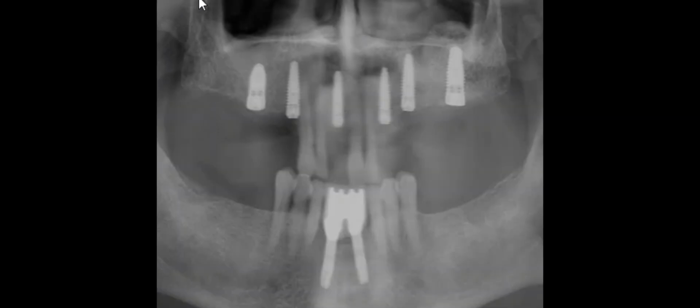Okay, here is the X-ray immediately after the upper implants were placed. You can see here the nice grafting of the sinus, providing us with significant bone in this area for this long implant. You can see that the implants are placed in very good alignment with respect to each other. This is all done without a guide, a surgical guide, or by eye-hand coordination. And this was in May 2019, and you can see the lower implants down here that were placed much earlier than that, and they're much the same now in the review x-rays.